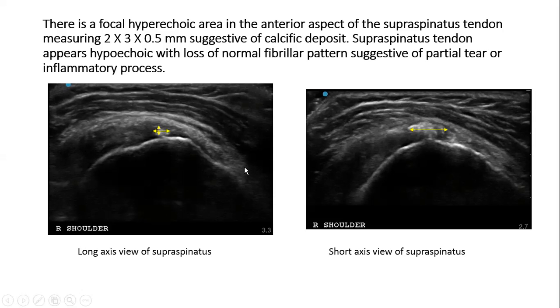I think I had that backwards in my brain. Normally you wouldn't see it in the proximal portion. You would see it somewhere in the distal portion of the fiber. So you define it more by whether it's the anterior portion. Here, this is where the supraspinatus is, anterior, and then this is the posterior portion. Of course, whoever is scanning also has to have the orientation correct to know that. It's always somewhere in the distal portion of the fibers, but the short axis view will tell you whether it is more anterior or posterior. Commonly it's more anterior, so you can see this is the most anterior portion.